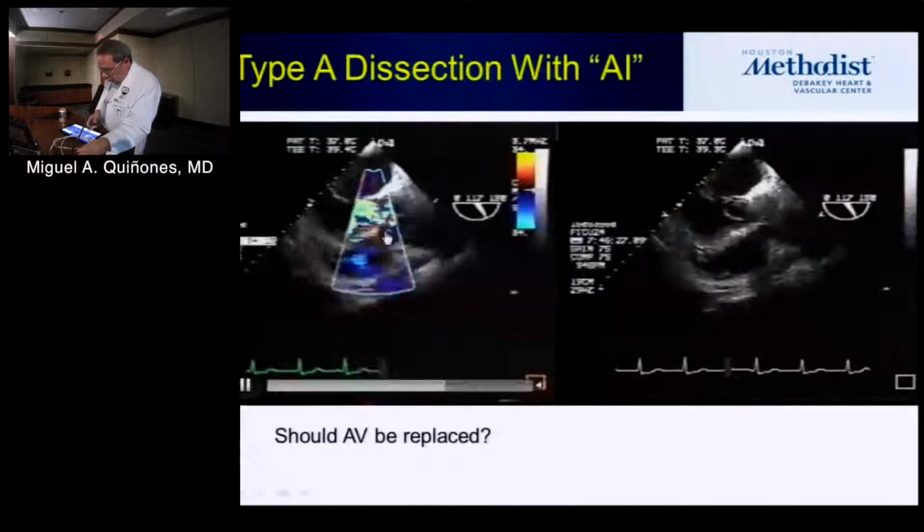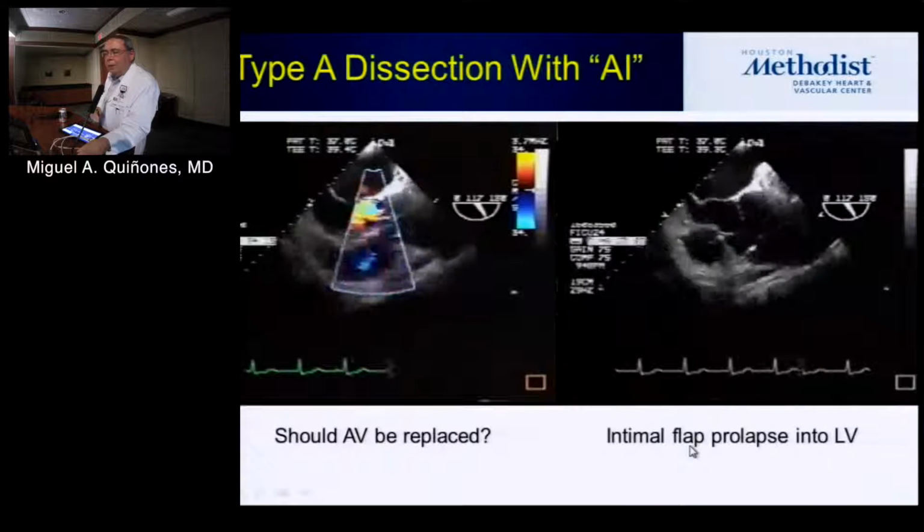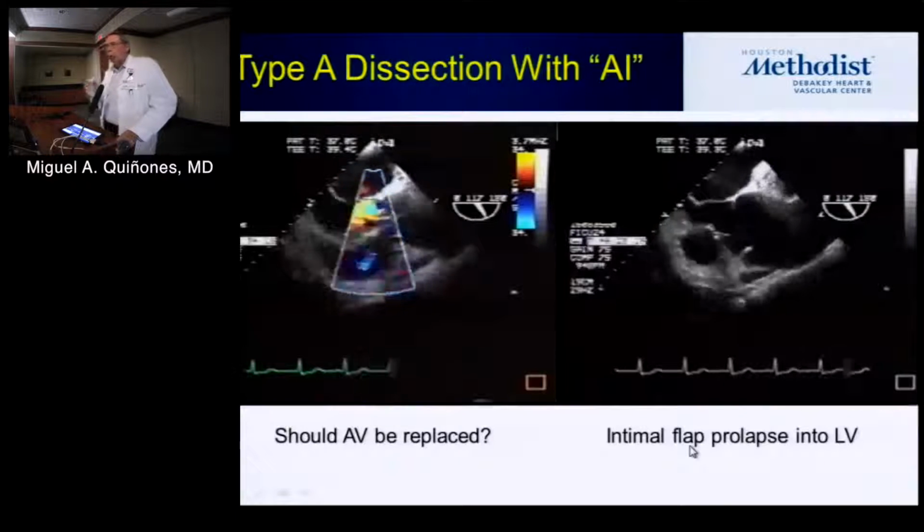All right, so there's a lot of color there, looks like a lot of AI. But the question is why? So, what do you all think? Jeff, what do you think is the cause of the AI there? Of what?